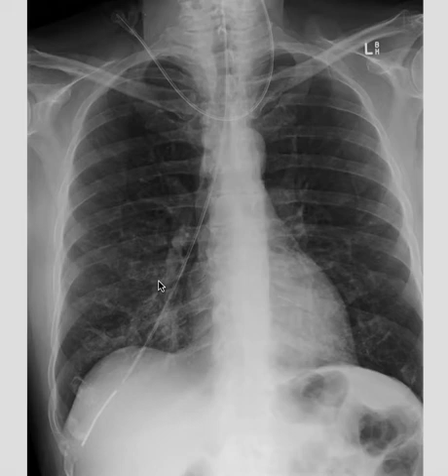lung lobes. So this is obviously incorrect positioning of the nasogastric tube and would have quite severe consequences if the tube was started to be used for nutritional feeding of the patient. If food contents were to enter the right lung, this could potentially cause severe lung parenchymal irritation, subsequently leading to pneumonia.